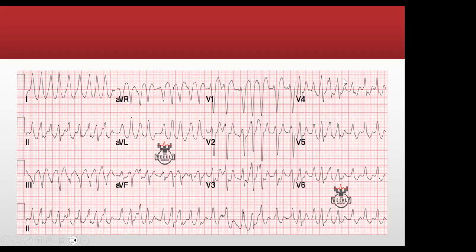And also, the axis appears to be an LBB sort of axis, which means that whatever is happening is not coming from the left ventricle, and so it's unlikely to be a VT also. Okay, so it's unlikely to be VT. Okay, any last comment from anyone?